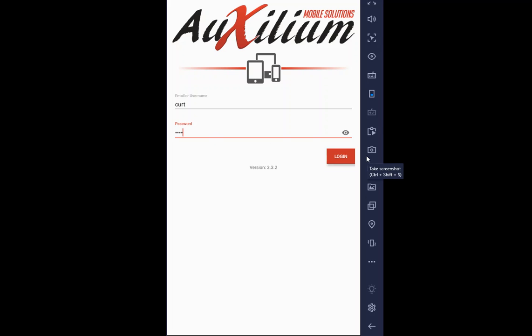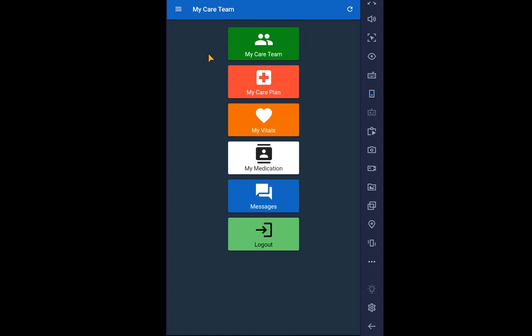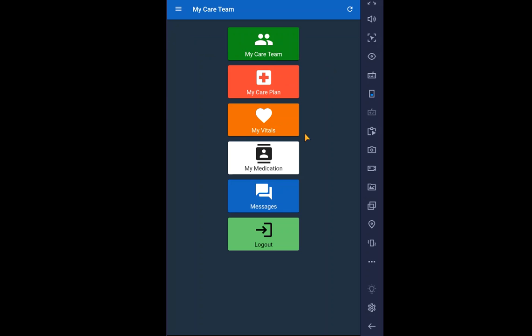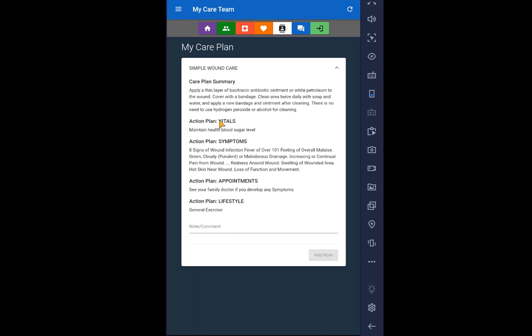And this is what the patient would see when they first log in. So the name of the clinic would be up here. They log in, and now they can go through the mobile app. I can see my care team. There's Dr. Raven. Here's a little bit of a biography on him. I can choose to send him a message by clicking on that tab. I can go down into my care plan, and I can see here's my simple wound care plan, and I can go through that information. Again, I can send information if I have any questions regarding this wound care plan. I can add those notes in here and then send that information back to my primary care providers.